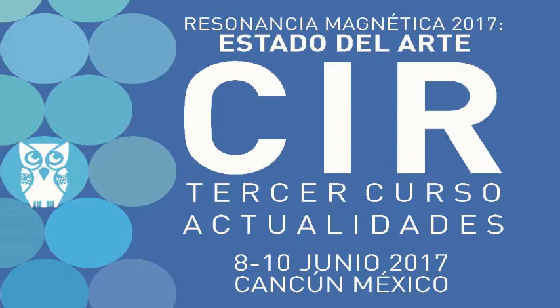Every time you see a small pituitary gland, it is associated with hormonal deficiency. We don't see this empty sella, which is an invagination of the subarachnoid spaces through the diaphragm of the sella turcica. So every time you see a small, thin pituitary gland very close to the sella turcica, it is not a compressed pituitary gland. It is a small pituitary gland.